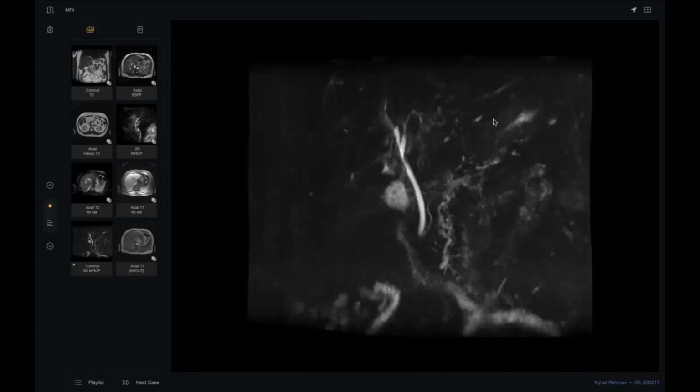No, they are not. I think there are no intraductal calculi. There is just the beading appearance and multifocal stricturing noted within the intra and extrahepatic bile ducts. No. See, the extrahepatic is completely normal. Fine. What happened here? Sir, correlate.